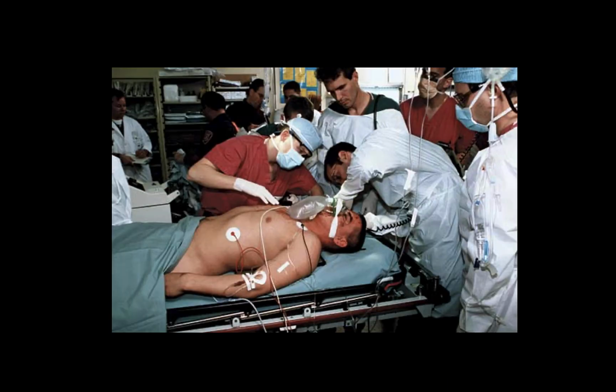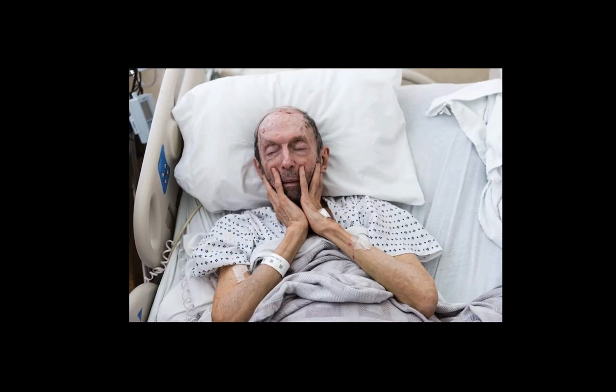I'd like you to imagine an unstable trauma patient arriving to your hospital. Your trauma team is activated and quickly a primary survey is underway. Most providers would reach for the ultrasound and perform an EFAST exam on this patient, as it's revolutionized our approach to sick trauma patients. But what about this patient?